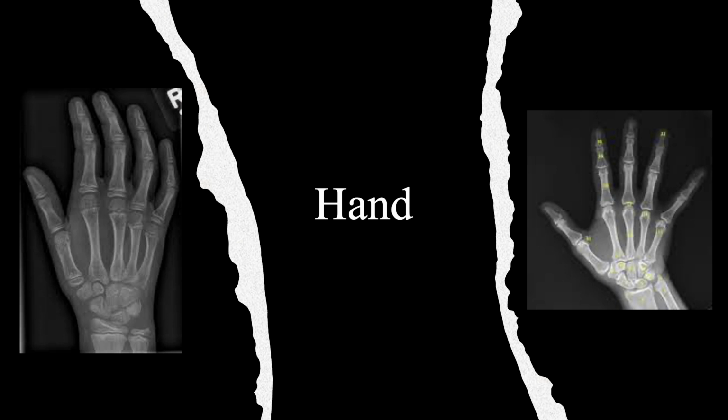Then you want to make sure that there's a visible gap at the fourth and fifth carpometacarpal joints. So that would be down here. I want to make sure that there's a visible gap between there. Then you also want to be very careful and look at the site that the abductor pollicis longus tendon inserts. So that would be on your first digit right here. You want to look for any irregularities or if there is an avulsion fracture. Because the abductor pollicis longus sits here and it has that force that can pull this way, if a fracture occurs here and it avulses, that entire fragment's going to shift out. So you want to just look at that very carefully.